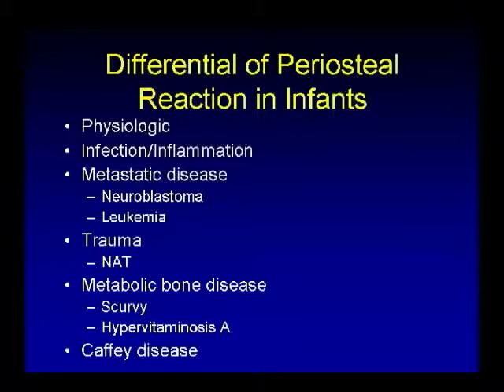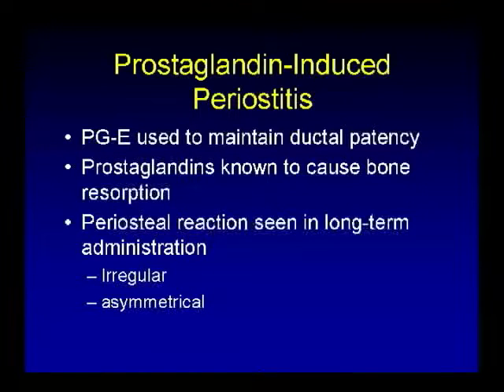You can have infection or inflammation. You can have metastatic disease, trauma. Dr. Patel showed you an NAT case, a non-accidental trauma. You can have metabolic bone disease and Caffey's disease. This was another case of prostaglandin-induced periostitis.